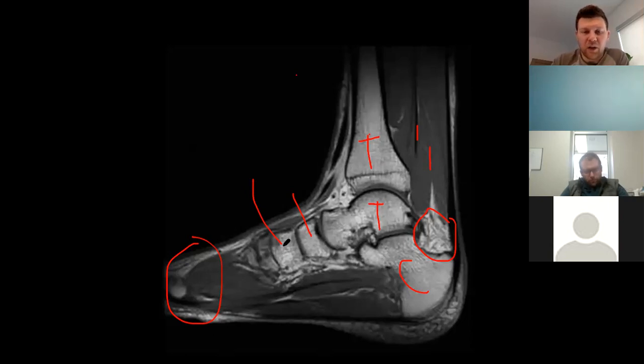We probably are looking at the second because what part of the calcaneus do we see here? Starting to see sustentaculum in there. Good. So we know we're more medial there, right? Yeah. Okay. When I mentioned a bit ago, what do you call this tissue? Is that the retrocalcaneal bursa? If it was a bursa, it would be fluid filled, right? Right.